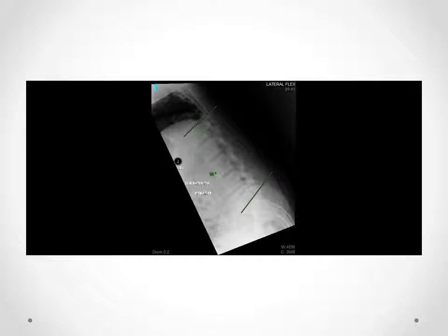That loss of 50 degrees of lumbar lordosis is distributed among each of the individual motion segments. So now when we measure each of the intersegmental angles and compare the changes of those angles from the neutral lateral, those changes should all equal 50 degrees of change.